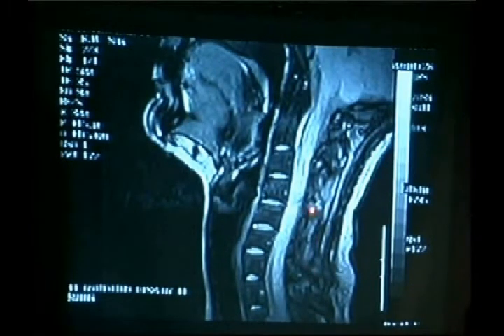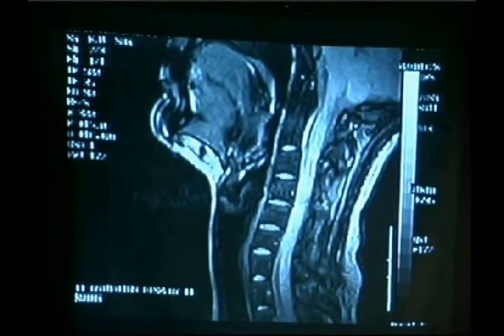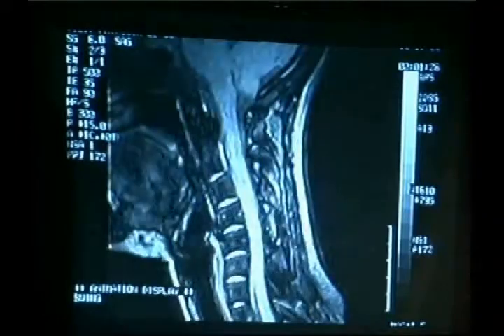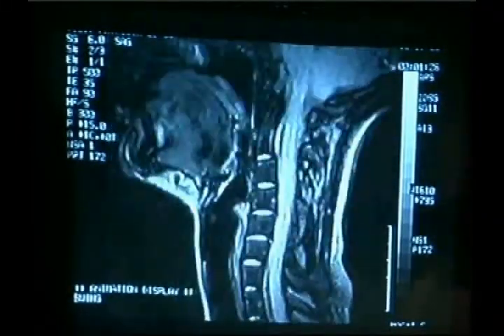This is the back of the neck where the facet joints are, right and left. Can't see them. Again, the person isn't standing, they're lying down. And they legally have to put animation on here because it's that looping together. So I just want to point out there is a major difference. Because a lot of lawyers will say, oh, we use motion MRI. And I go, well, there really isn't motion, and let me tell you why it doesn't find the injury.